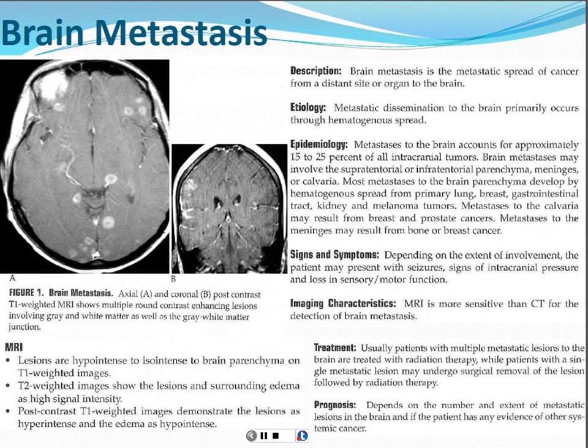We usually do our post-contrast imaging in at least 2 planes, to make sure that you see all the lesions and can really get an idea of what size they are in 3 planes and that kind of thing. And then once they start treatment, then we can evaluate for change in size and change in number of lesions well. So we'll do some kind of thinner section imaging, T1 weighted imaging after contrast. The way that they treat brain metastases, it depends on what they're from and how many they are.